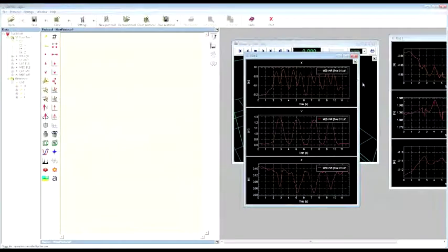As you should remember, I've told you that I have voluntarily created some gaps in the collected data. So, for example, in this case, you can see that we have some gaps in this trajectory. So, if I want to fill these gaps, I can choose to perform an interpolation within the trajectory.